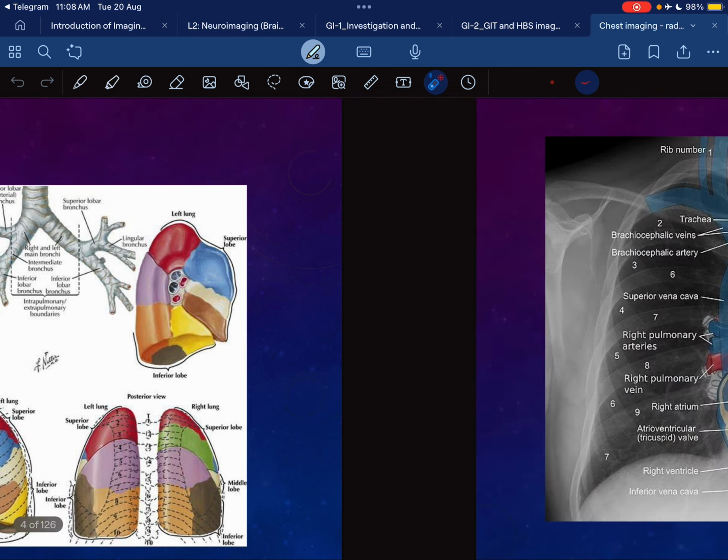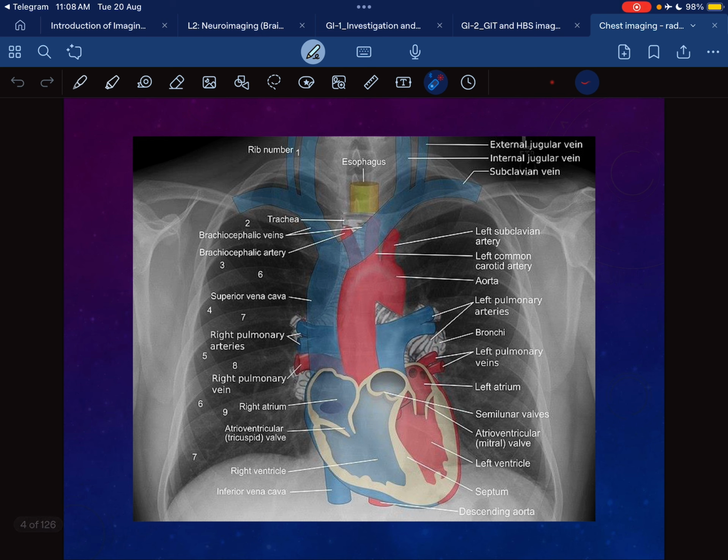When we comment on a chest X-ray, the way I do it is to assess the center of the heart, the center of the chest X-ray, and go peripheral. So the first thing I assess is the mediastinum. How does the mediastinum look? Is the patient centered or not centered or rotated? So the patient is centered. Is it a good image or a bad image? And then how does the trachea look? Is the trachea centralized? Right main bronchus, left main bronchus, do they look well?